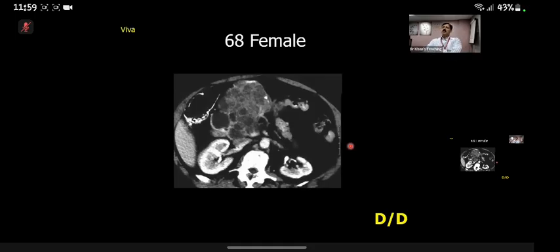Okay, this is your last case, number 7. Can you tackle this?